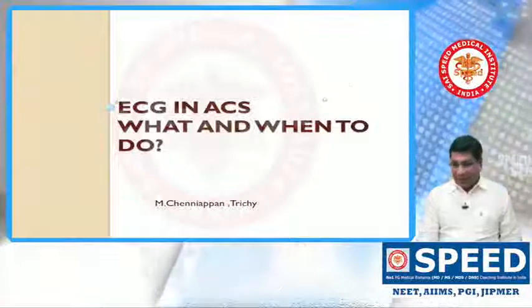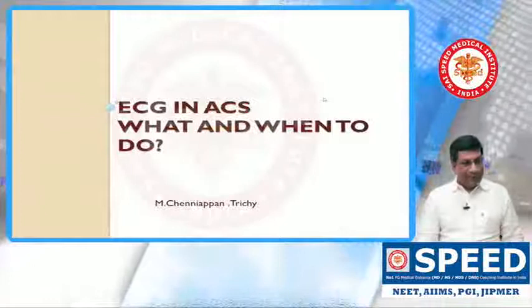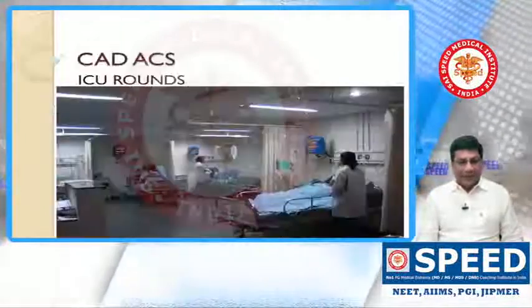So for each bed we are going to see one ECG and decide what is to be done. That is the format of this program. This is ICU rounds.